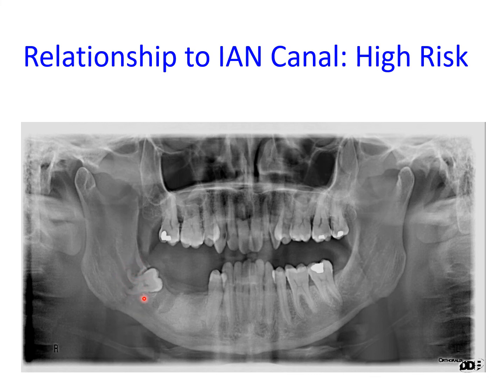So this is an example of a very high risk mandibular third molar, and it might warrant a cone beam CT before you carry out any operative intervention.